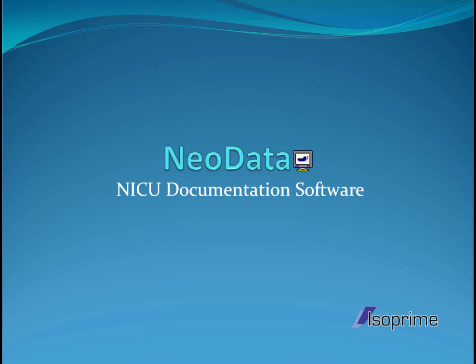This is a brief overview of the NeoData product. NeoData is a computer software program used by neonatologists to track their neonatal intensive care patients.